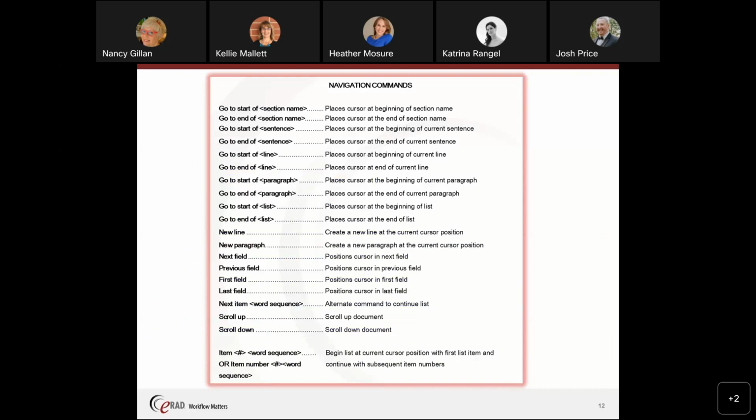Okay. Little caveat to that is no matter who is doing the template, you have an option to save it to your dictionary. Next to that dictionary is a little drop down. So the spell check, you can add it to global as well. So for those of you that do templates for your radiologist, if you add it to the global spell checker, it won't come up for anybody as a spell check and they won't have to add it themselves.